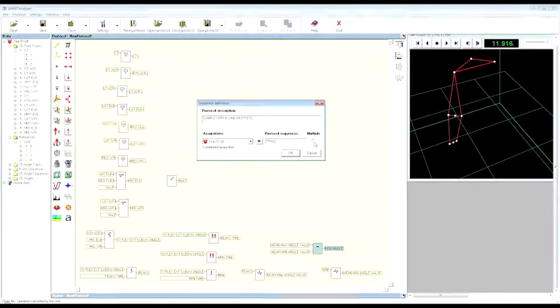If you select the multiple option, that means that everything I have created in the protocol, all the computation that I have performed for the single trial, trial 01, will be applied automatically once you load more than one trial into the protocol.